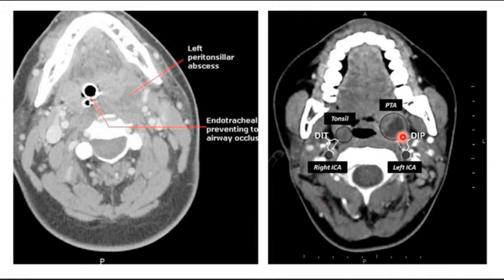It's important to assess the distance between the tonsils and the internal carotid artery. Sometimes there is a variation of the internal carotid artery which has a very medial course. So whenever we see an abscess, we have to measure this distance, because when we do peroral drainage or other interventions, it's important to know exactly where the vasculature is around this abscess in order to avoid traumatic injury to the carotid artery.